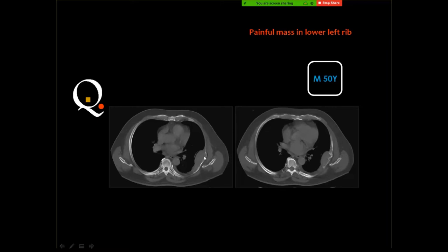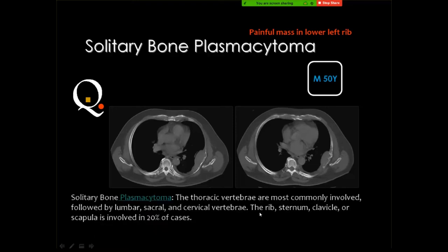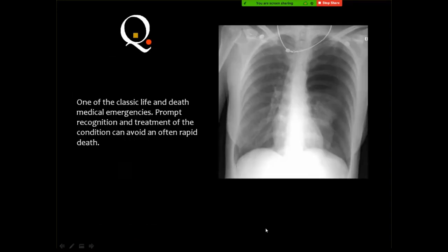Then you mention immediately after it lymphoma, and then metastatic deposit. These are the most frequent three lesions coming after each other. Then the primary lesion in this location with some expansion is myeloma. Then you follow it by lymphoma, and finally metastatic disease, and this has been proved to be a plasmacytoma. Okay.